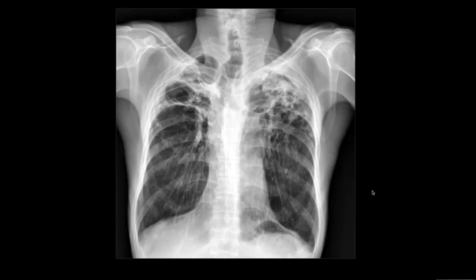This frontal chest radiograph is showing marked upper lobe fibrosis. Again, there are irregular opacities and reticular changes in the upper zones, causing marked volume loss. You can see that both hila are elevated. Perhaps there's some high density area in that region, representing an area of calcification. Now, this was a confirmed case of chronic pulmonary tuberculosis.